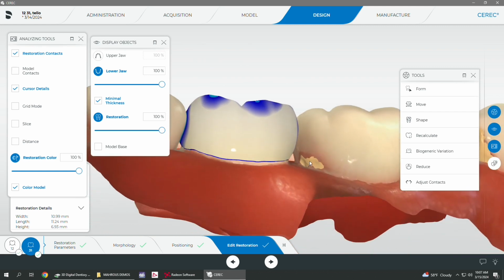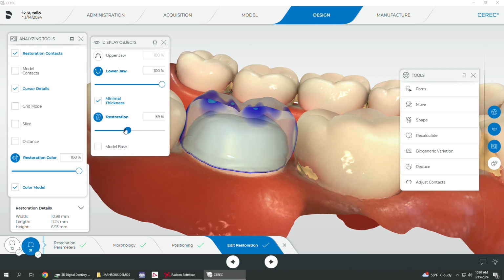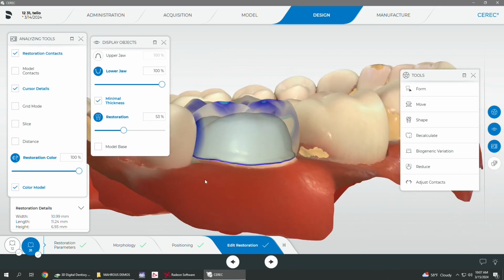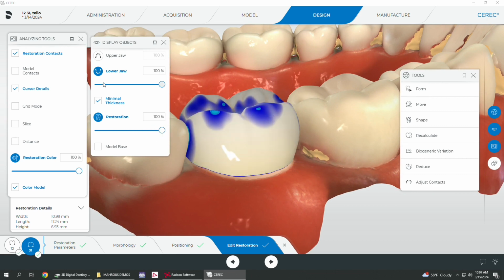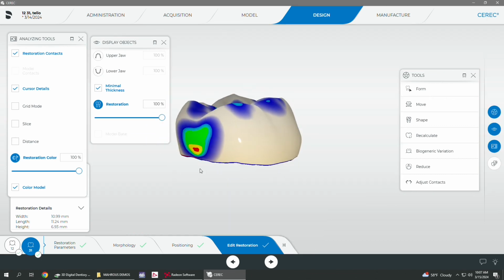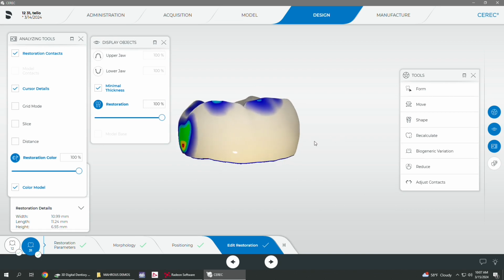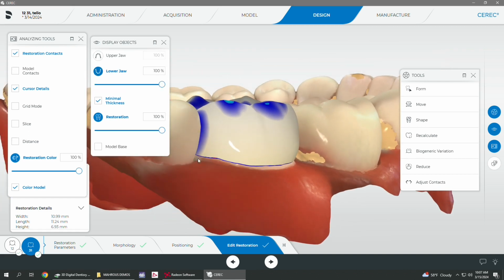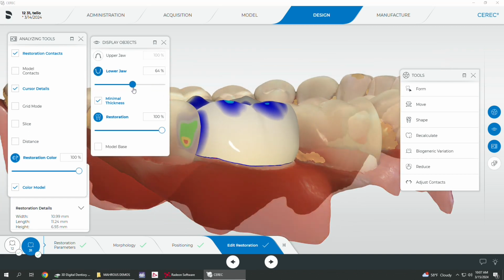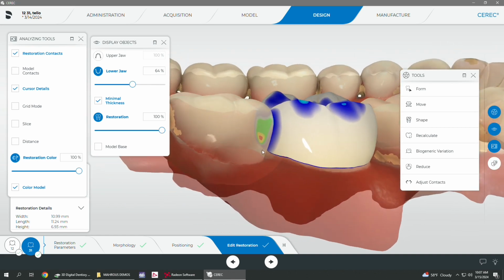An area commonly adjusted is the gingival embrasure. This is common in patients that have a big prominent gingival embrasure, as is the case here in this typodont. We will need to modify that gingival red spot. Usually, this is a contact with soft tissue. However, in this case, it actually contacts the tooth, which will make it very hard for the crown to be seated because nothing is supposed to be wider than the proximal contact area.